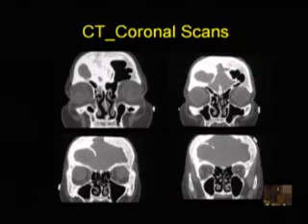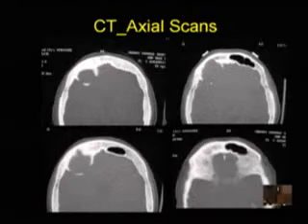Apart from the seizure, was there anything relevant in her previous history? Nothing else. First time, 85-year-old lady. She has had no nasal symptoms of any kind. Does that communicate with the other slides? I can see an area there. I think it may well be, but when you follow the sequential cuts all the way down, was there any communication between that residual frontal sinus and the cyst? No, we didn't think there was a communication.